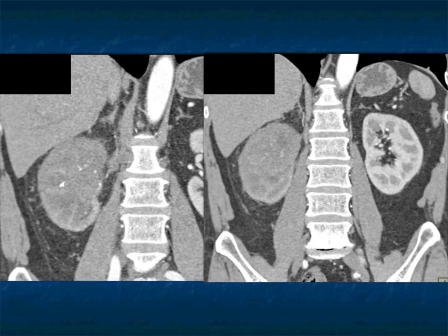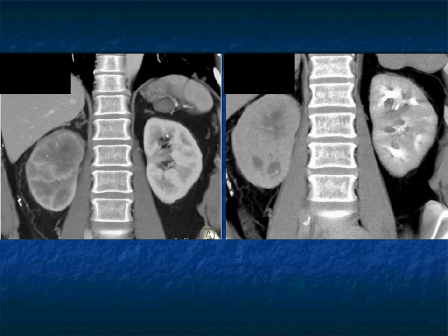Not a whole lot going on in that kidney, though the size is correct compared to the contralateral left kidney. And as you go through the images, even as you get to the excretory phase, you can see there is some function in the kidney. The calyces you really never see. You see some dilated calyces perhaps. You don't see opacification. And you could think about an infiltrating process.